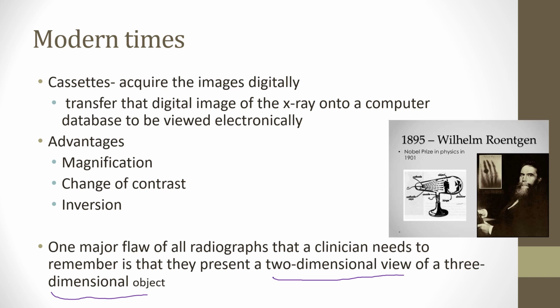You got to keep that in mind, that you're looking at a 2D picture of a 3D object, and therefore it can make it a lot harder to interpret. And that's one of the reasons why X-rays are not something you can just get right away. It's more of an art than a science, is how I usually describe it. You got to practice at it and practice at it and practice at it before you really get to the point where you can see most of the things that you're supposed to see.